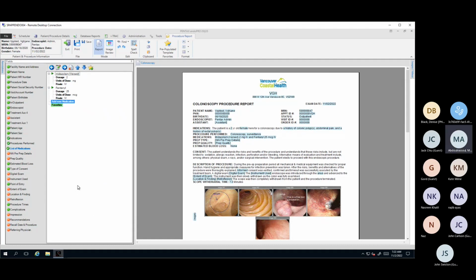So if you noticed when I was inputting this medication, that was quite a bit of clicking involved to get that across. So this is one of the ideal areas where you can utilize what is known as a field favorite. A field favorite will save components that you would use commonly so that you don't need to re-enter them all the time. So let's say this is my starting point.